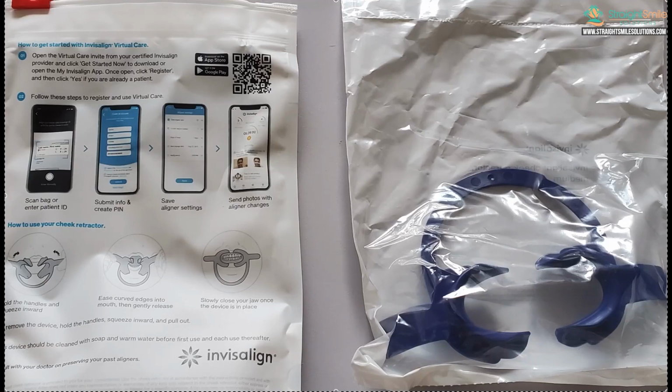They will need to download the My Invisalign app, and then they'll need to sync it from the app to your account. So there's a little QR code there. They can do that. It's pretty easy. My suggestion, if you're going to do this on all your patients, is to set it up on their phone when they're in the office, unless they're super tech savvy, because we found it kind of challenging. Maybe not for someone who knows apps and text, but for an average consumer, we thought it was kind of challenging. There's got to be easier ways to do this.